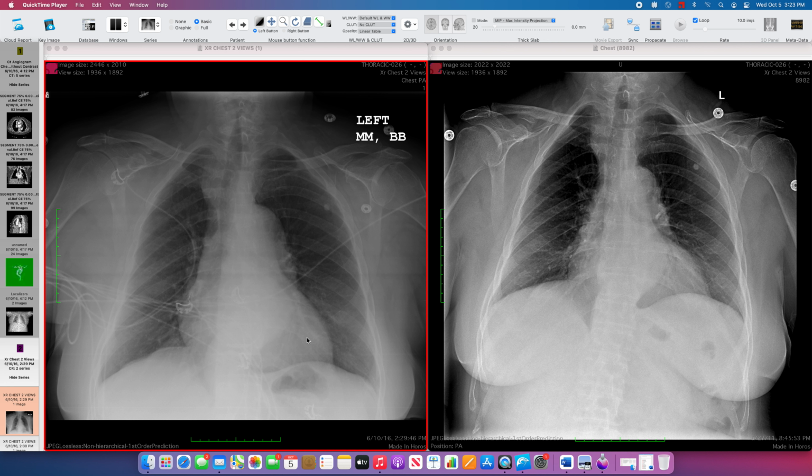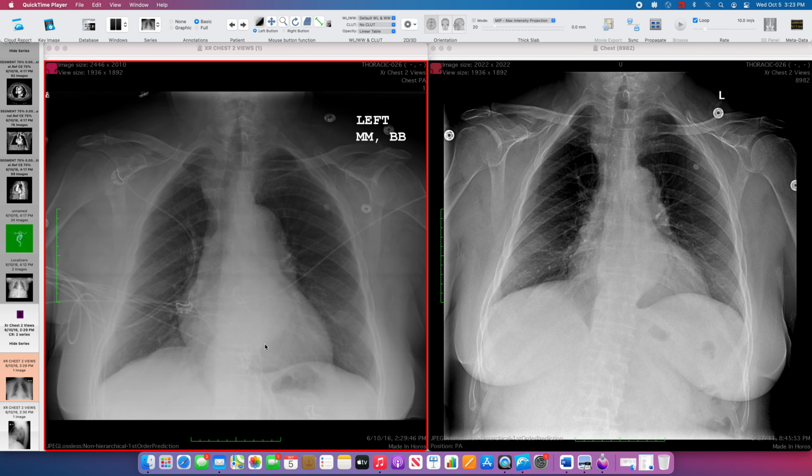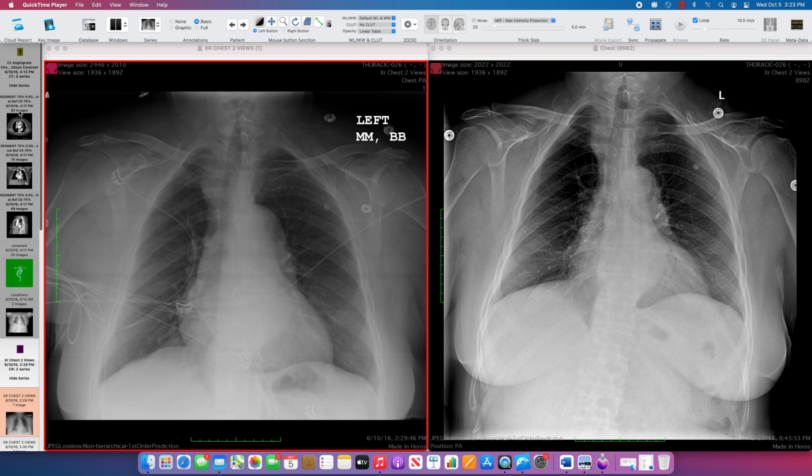The chest x-ray does rule out some alternative disease such as pneumonia or pneumothorax. Basically this is a very similar appearance of the chest compared to prior. But with a classic presentation, the patient went on to a CTA chest.